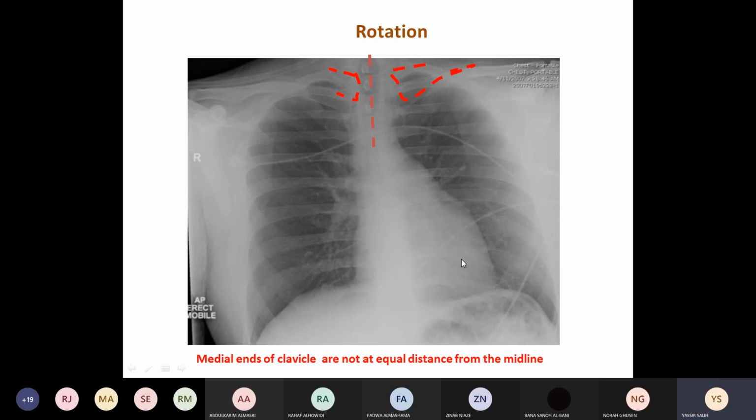Normally, the chest X-ray should be equal in translucency or blackness. The lung contains air, and the lung appears lucent due to this air. But with rotation, one side appears more opaque. The part closer to the film is more opaque than the other one. So we know that when there is a rotation, this may affect the image.